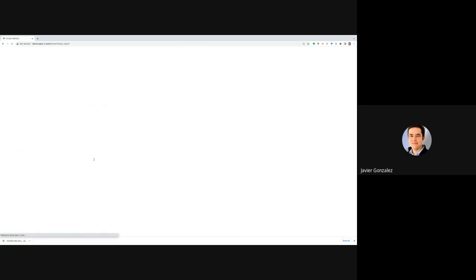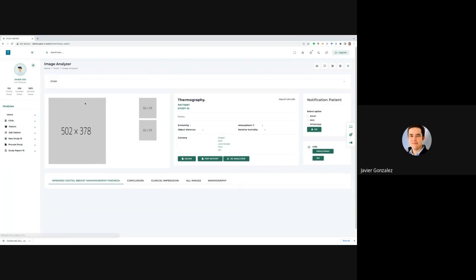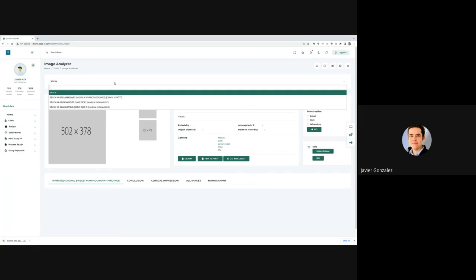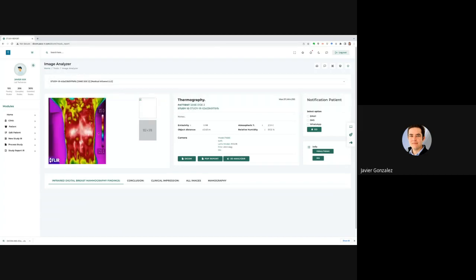Let's see, so you click report. You need to select which report you want. This is Jane Doe 2 with the handle. That's the report we want. This is the main image we selected.